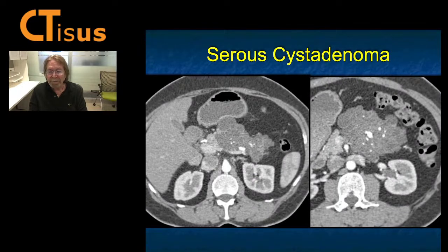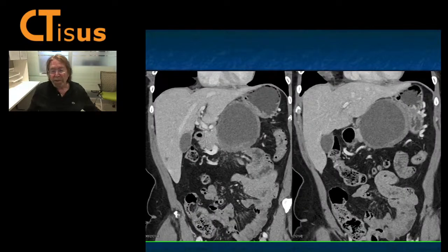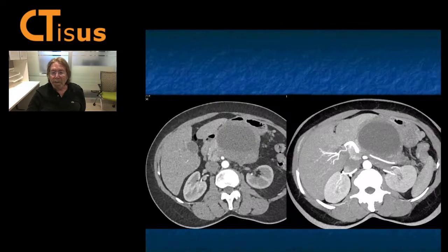What a great case. Now here I'm just showing another cystic lesion. It has a thickened wall, same location as the last case, but thickened wall, junction, body and tail of pancreas, 40-ish-year-old female. The thing you got to consider, number one, MCN, mucinous cystic neoplasm. Yes, I could have considered SPEN, but SPEN has more solid components, more calcification, but it could be. It's not metastatic. It's not going to be an adenocarcinoma. This was an MCN. Okay, we're getting near the end.